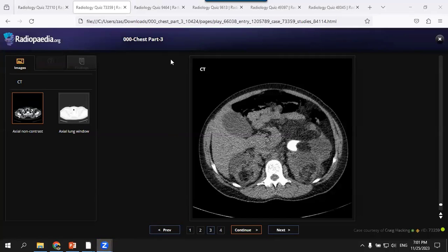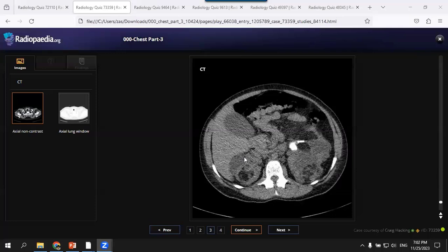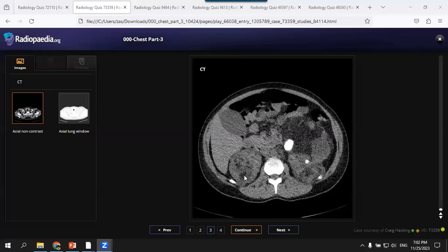And I would also like to see the brain images. Good. So now you see a mediastinal or soft tissue window can complete the case. So you have to know what the rest of the findings are. As in cystic fibrosis, look for the liver, look for the pancreas, fatty changes, portal hypertension, and so on. And here, angiomyolipomas because of the tuberous sclerosis. Then you can recommend brain CT or MRI.